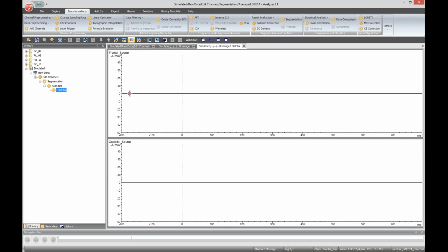The output here looks like a flat line. The reason is that the scale I'm using right now fits the voltage values of a typical EEG, and it was not appropriate to display my source strength values. Current source density values indeed have very small but non-zero values. So what you need to do is decrease the amplitude range to be able to see the source signals.